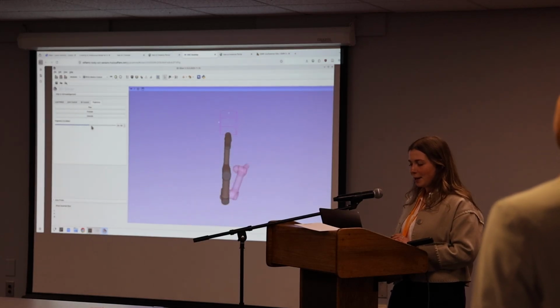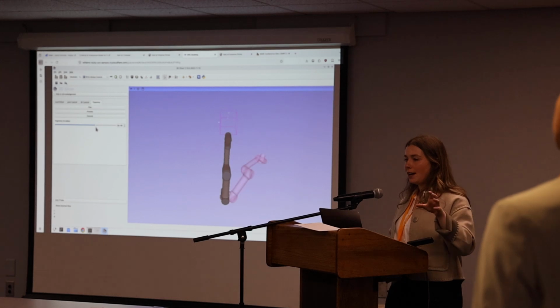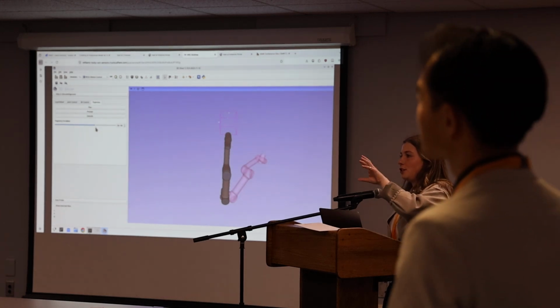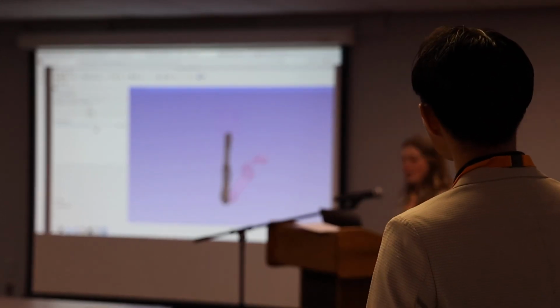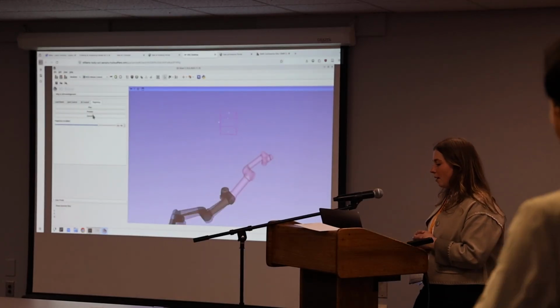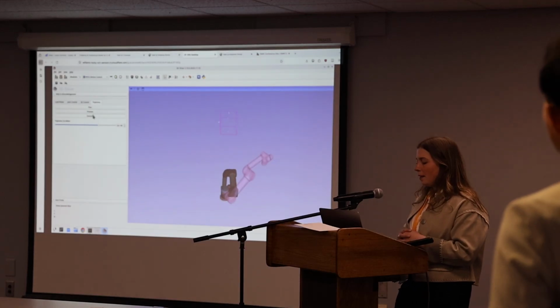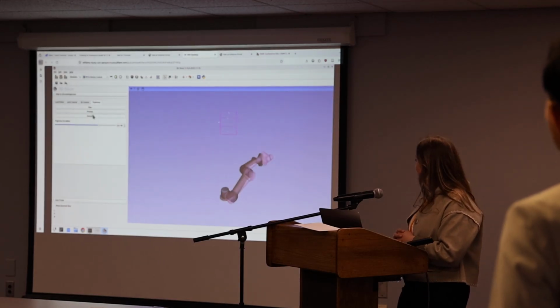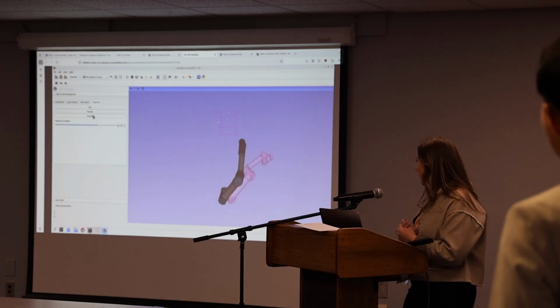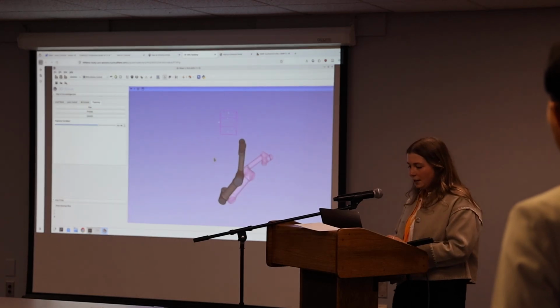Anyways, you can scrub through the trajectory at each state. Again, this is the nice part. You can imagine if you had an AI generated trajectory for a medical image, you could have the surgeon preview what it's going to be, look at each layer that it goes through, and then decide. And then if you press execute, it'll follow that motion. So hopefully useful for that. I really think for a surgeon-in-the-loop kind of context, this is a nice tool.